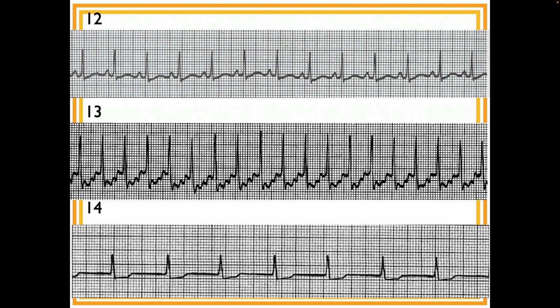It's regular, and it looks like 120-ish. I can count this time. There are P waves present, and they're all upright. So that would make it, it's tricky because it's too easy.